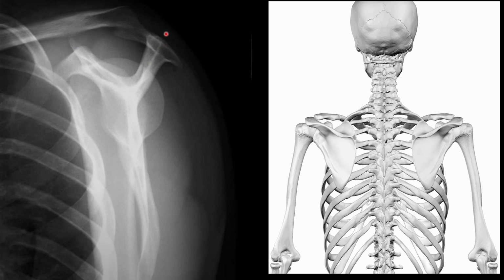So we notice how it makes a Y right over here, and this can be a bit confusing to orient with initially. The way I think of it is it's posterior to anterior, and the beam is going this way from the back and capturing these structures, kind of going at an angle. Over here, this is the acromion, this is the coracoid, and this is the body of the scapula.